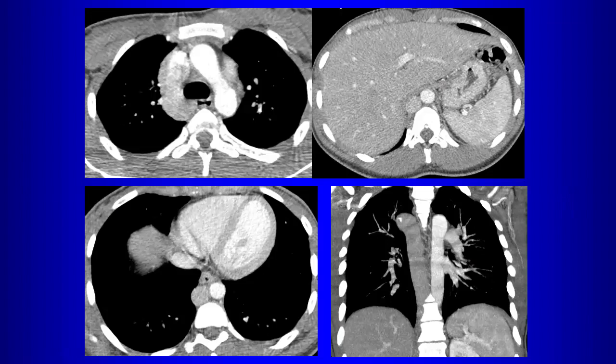How do we recognize it as azygous continuation of the inferior vena cava? The liver. The intrahepatic inferior vena cava is absent, right? So absence of the intrahepatic inferior vena cava is the hallmark of azygous continuation of the IVC. So what happens to the hepatic veins? Stumped. They form a smaller IVC.